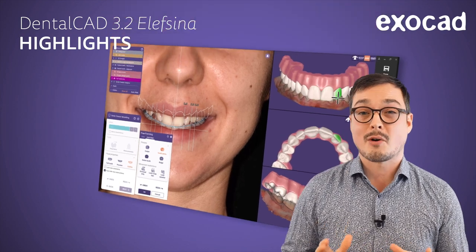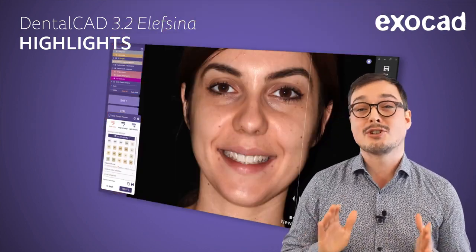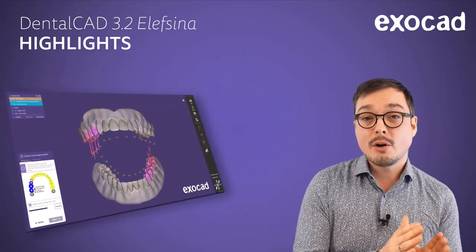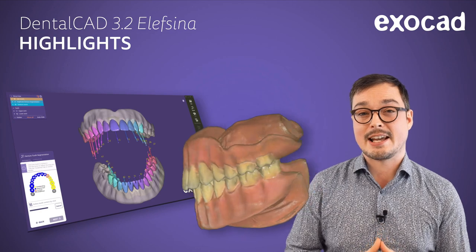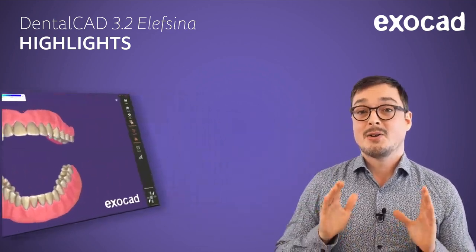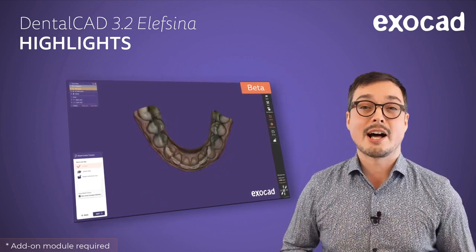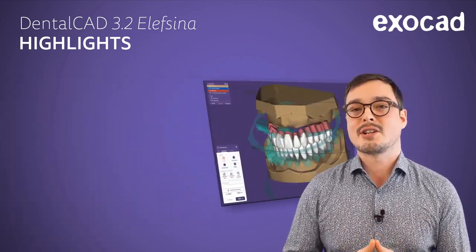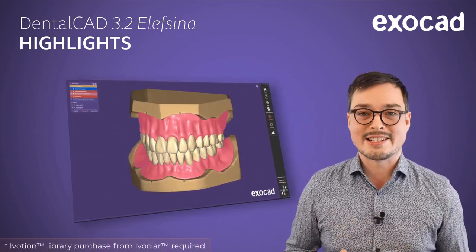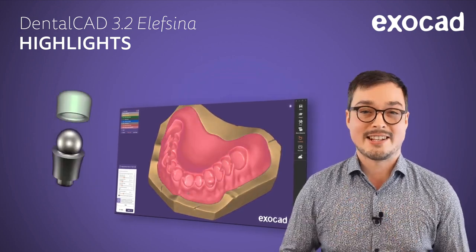You will love our elevated smile creator, which provides better visualization based on patients' natural teeth. Our new copy denture workflow segments all teeth and the gingiva from the scan data, so you can recreate a new set in no time. You're also able to export colored models with the optimized parameter for multicolor printing. Make use of the Ivotion Denture system add-on that's now available for all our resellers. Let's not forget the ability to now design dentures on ball attachments.